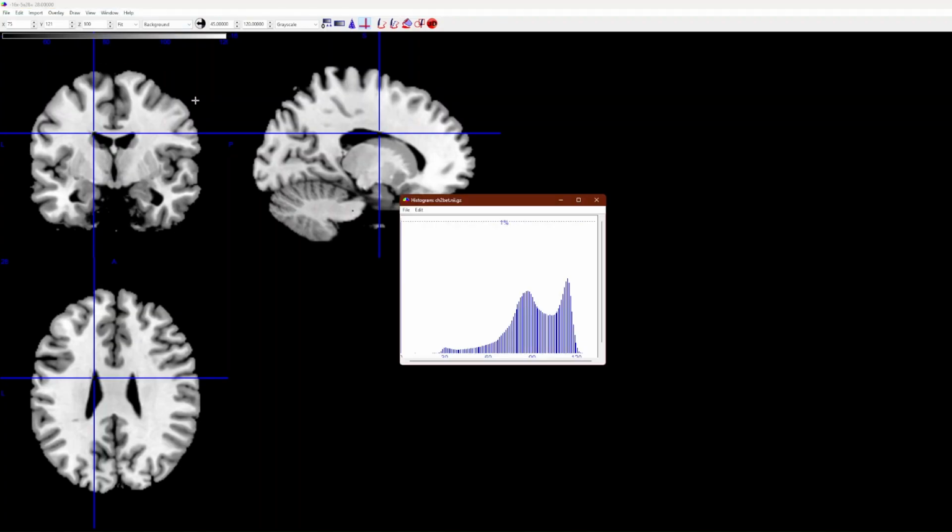The histogram view shows the voxel intensity distribution. It shows the distribution of voxel intensities in your MRIs, useful for understanding intensity ranges, checking for bias or noise, identifying outlier voxels, selecting thresholds for overlay, mask, or segmentations, comparing scans with different contrast. The x-axis is the intensity value, the y-axis is the number of voxels at that intensity. A plotted curve shows how intensities are distributed, shown here. This information can be useful for detecting any errors in your data as well.